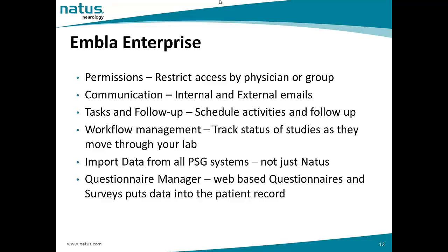In Enterprise, we have something called workflow management. That means you can track the status of the studies as they move through your sleep lab. For example, from the date they were referred, to the time they were scheduled for the sleep studies, then to the time the studies are scored, transcribed, and closed.